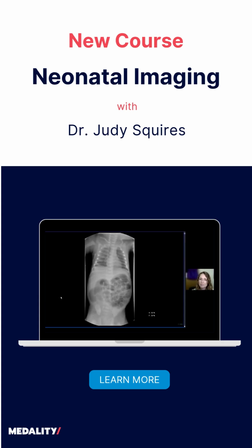So this patient came to our fluoroscopy suite for contrast enema later that same day, or maybe it was the next day. We always start with a scout radiograph just to get a lay of the land, make sure the enteric tube is in the appropriate position, and we have a similar abnormal appearance.